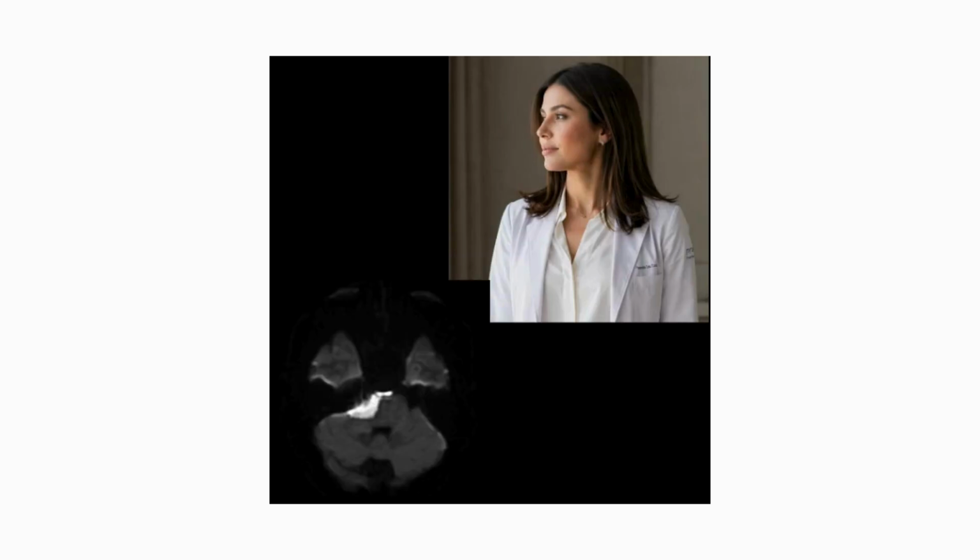The plot twist. The epidermoid, wolf in sheep's clothing. Just when you think you have it narrowed down, you see a lesion that looks like cerebrospinal fluid on T1 and T2. Is it an arachnoid cyst? Not so fast. Key teaching points.